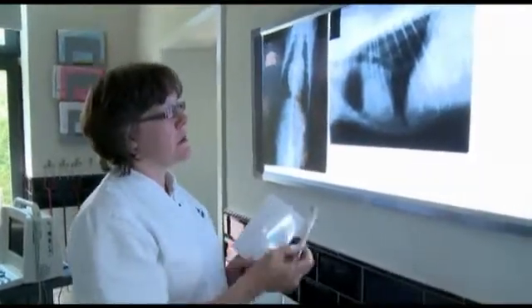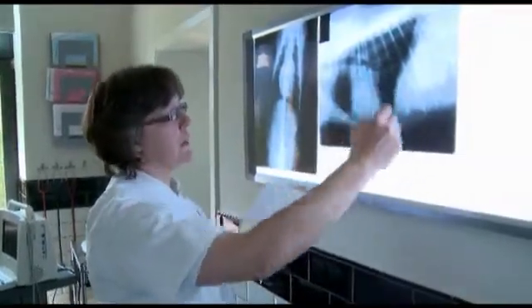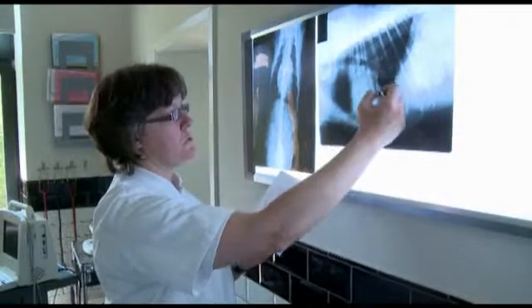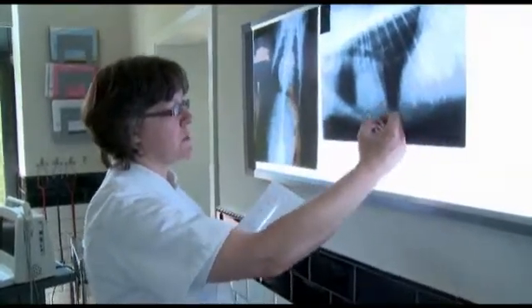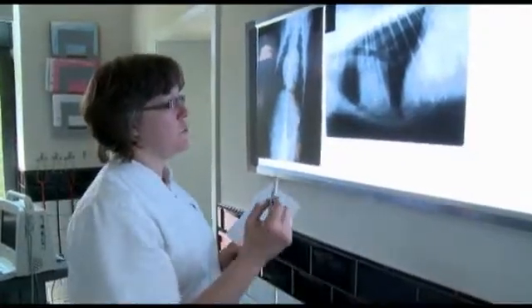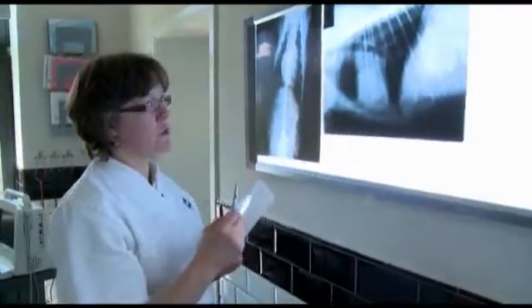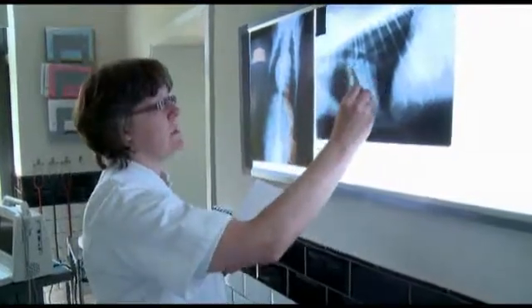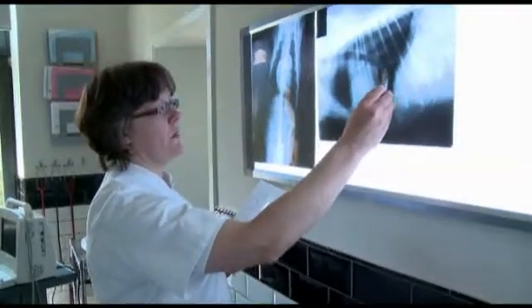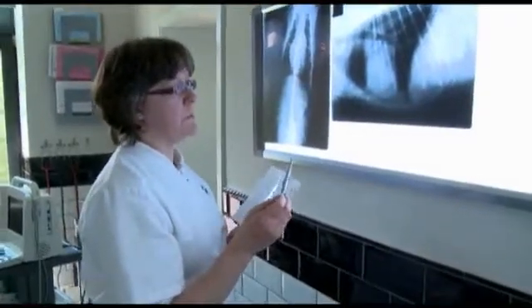If we're looking at this cardiac shadow, it is dolichocephalic, a little bit elongated, and we have the left atrium at this 1 to 2 o'clock position. This is where the left ventricle is located. The right ventricle is at the cranial heart shadow border, and the right atrium is sitting at the 11 o'clock position. We normally clearly also see the aorta with its ascending aorta and the aortic arch, and the caudal vena cava bringing blood back from the abdomen.